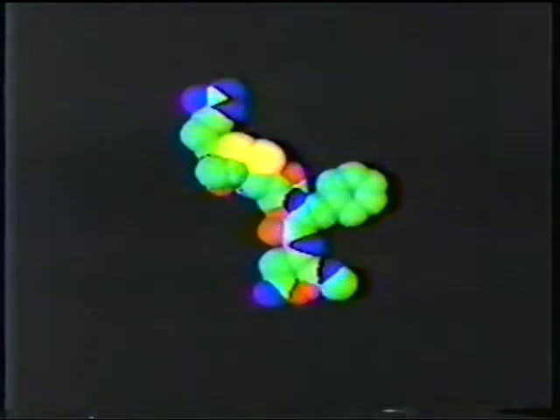Here you see about 8 updates a second on a 50-atom molecule. The VAX computer reads the hand control and sends viewpoint rotations to the Adage Ikonas, which calculates the hiding and shading and fills in the pixels in the double buffered video frame buffer. When you look into the mirror, you see each dot in the image at its proper depth because the dots are sorted to synchronize with the vibrating mirror. Watch. As we start the mirror vibrating, the single vertical line is drawn out in depth to reveal the letters U and C. Several people can watch at a time without special viewers or glasses.